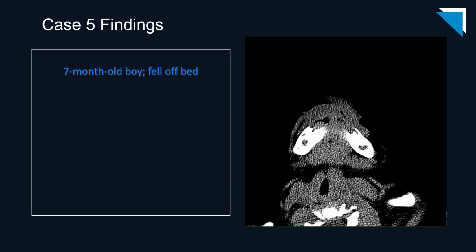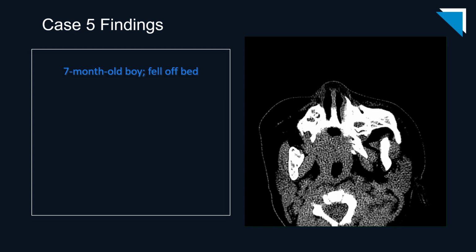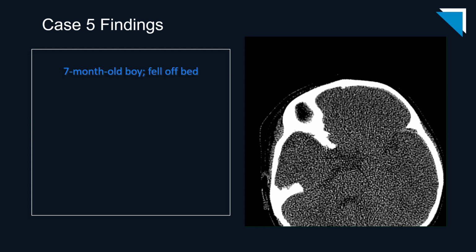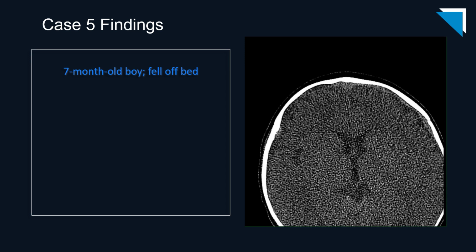Here are the soft tissue windows from the same study. Again, we're looking for soft tissue swelling or lacerations. Always evaluate the globes, as we discussed earlier.